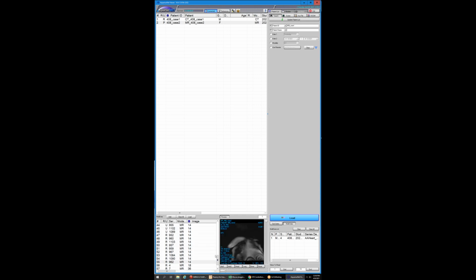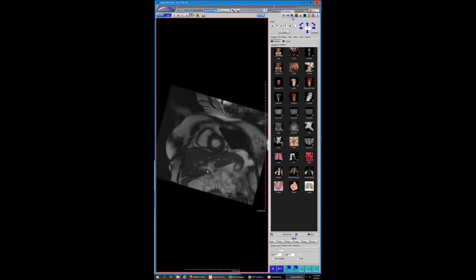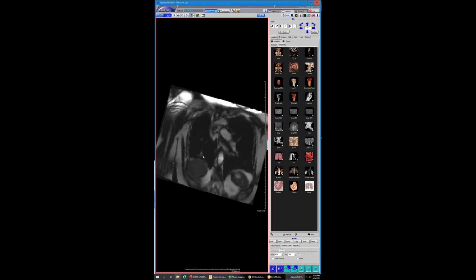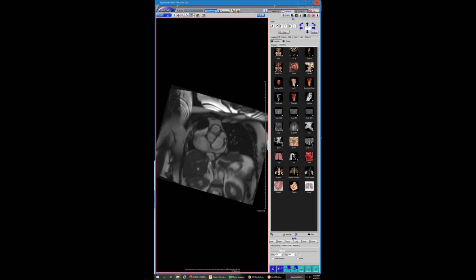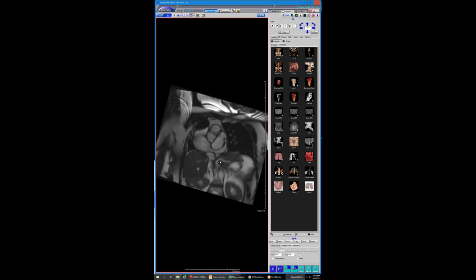There's one shot where you can nicely see the reason why I think a lot of these patients wind up asymptomatic, in my going theory on this. Here you can see a little bit better. On the cases that I've noticed where patients are asymptomatic, and again, I've seen this a lot specifically in older women, the anomalous vein that drains into the IVC gets extremely tight and narrowed as it goes across the diaphragm, and it gets compressed between the crus of the diaphragm and the IVC coming up.